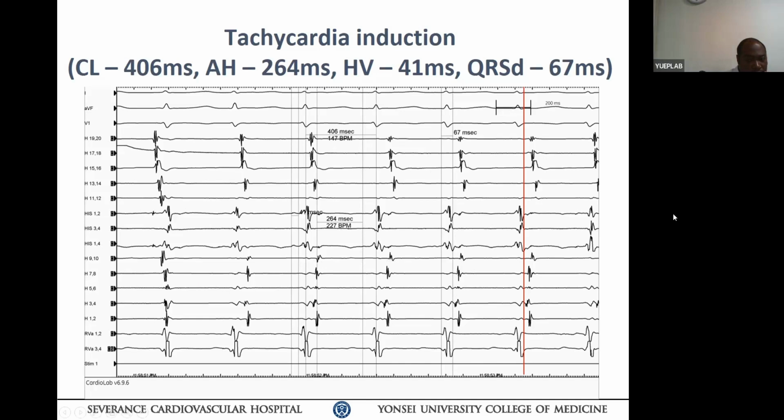In other words, the RA and LA activation are quite different and separate. That's why I said this is a double tachycardia. That's the whole point of this slide. Any other idea, Kofi? During RV pacing, you also showed that there was an eccentric activation. Right. So I think the patient had a double tachycardia.